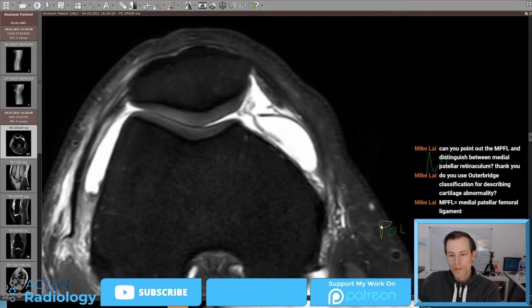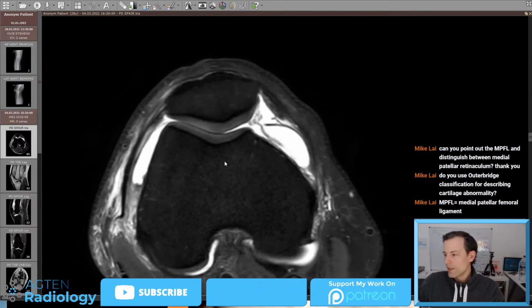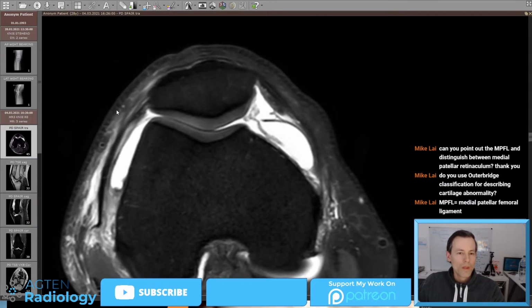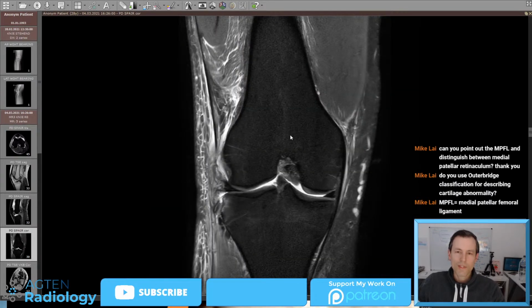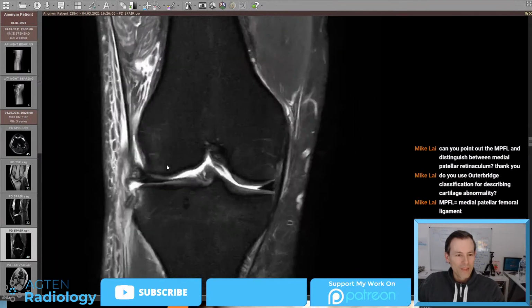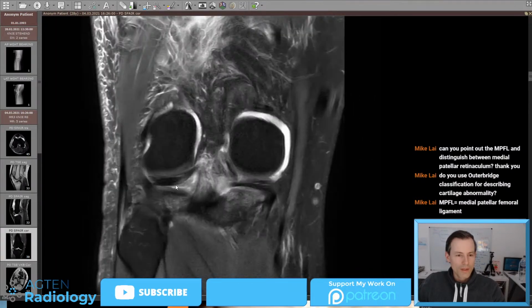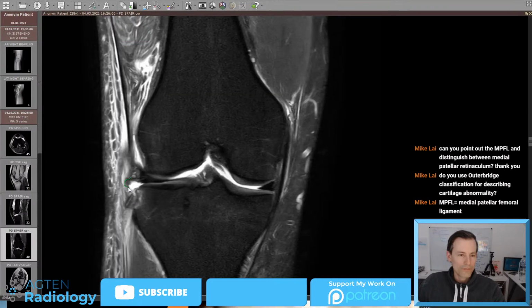So I misunderstood that, Mike. I was thinking you were talking about the plica. Sorry about that. Okay, got it. If it's still not clear, just write me down here. We can have a look at it again. So I think we were on the lateral side. I was just wasting a little bit of time here. Alrighty.